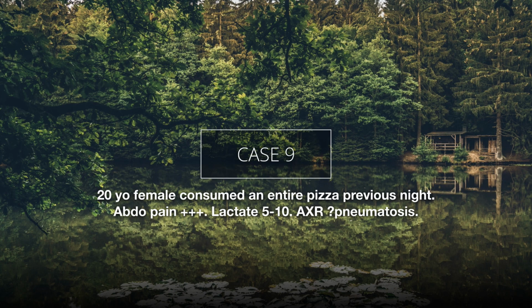20-year-old female who has consumed an entire pizza the previous night. She's come in with abdominal pain with a raised lactate. And the abdominal x-ray she had, which we haven't got here, suggested she has some pneumatosis.